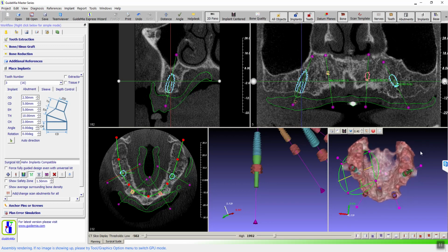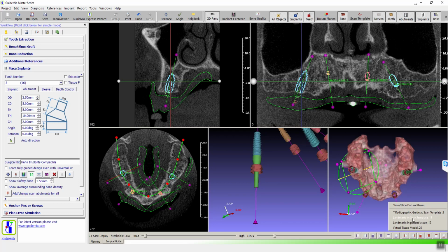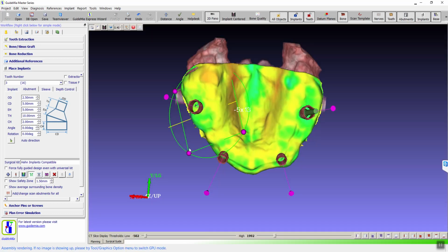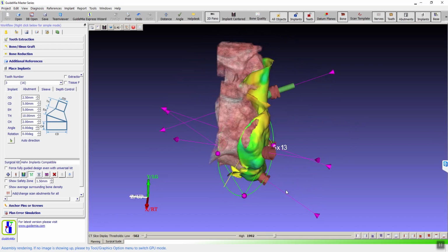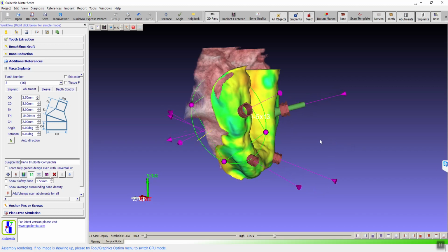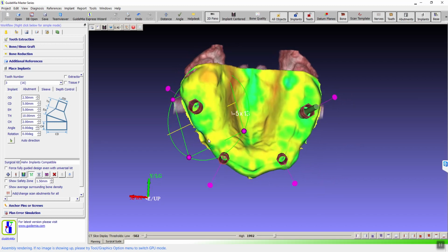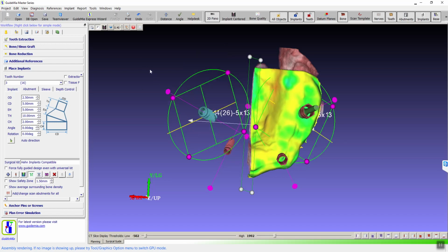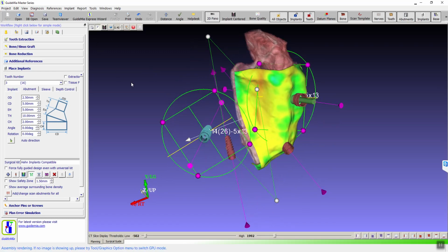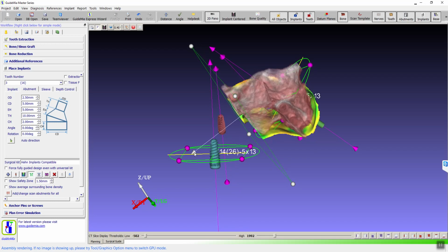So you see this is the implant and the bone structure. Let me show back the virtual tissue model. So this is about the occlusion surface, right? And this is about the normal orientation. We see the occlusion surface. But if we really want to make it more accurate, we have this clipping datum plane. We can play a little with that.